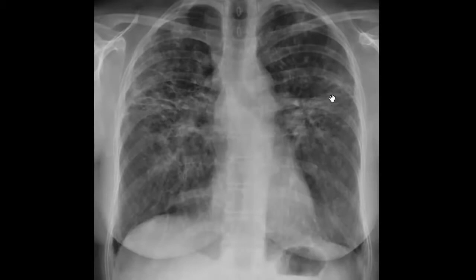As the lung shrinks in volume as a result of fibrosis, it can produce what is known as traction bronchiectasis. So shrinking interstitium pulls bronchi to dilate them in a non-uniform way. So this probably is a dilated bronchial branch. You can see thick walls on both sides, and this is the same thing, a dilated bronchial branch.